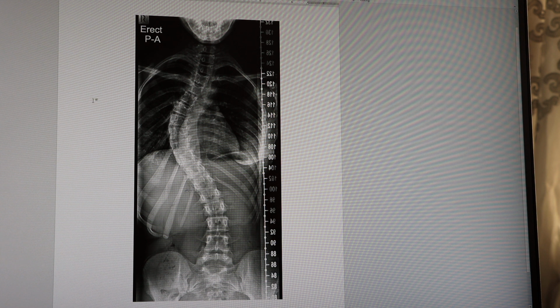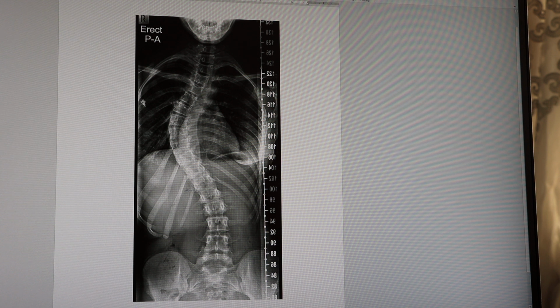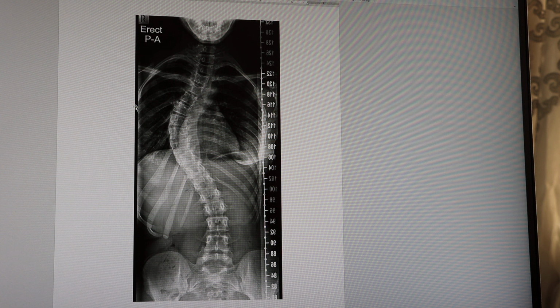For the first time investigation, it's more appropriate to have it in full, and the reason behind that is you want to identify if there is any congenital anomaly in the spine. As you know, throughout the history taking part, you will be able to say, okay, most probably my patient is idiopathic.